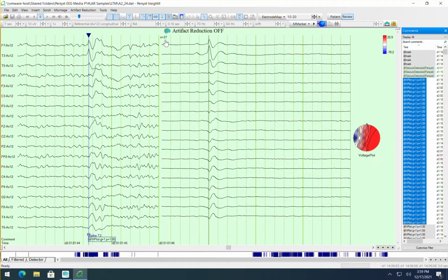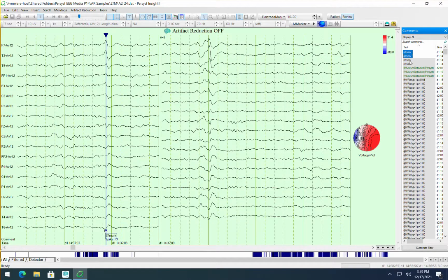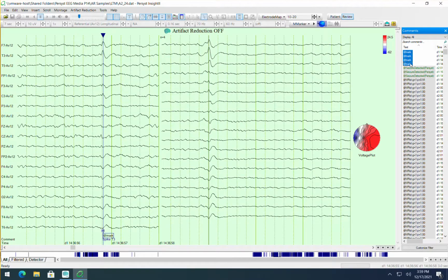Now it's averaging 37. So in this case, I've taken manual control of the averaging and determining that point in time in the recording at each point where the center of that average is going to be. And by using either the shift or control key, I can multiple select, indicate the number of points that are going to be averaged here. There's 4 points in time that are part of this average when I've selected those, and there's the display. That is back averaging.